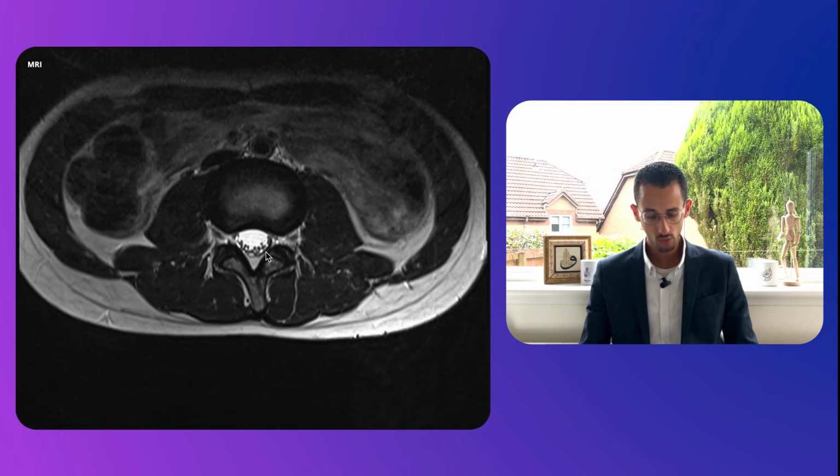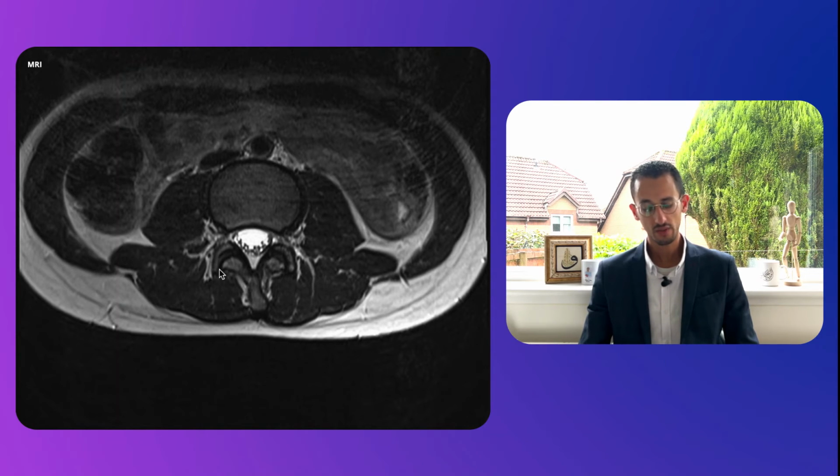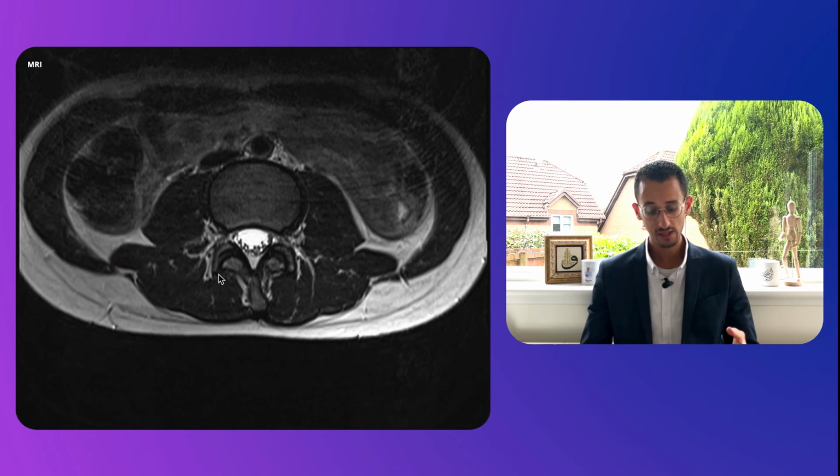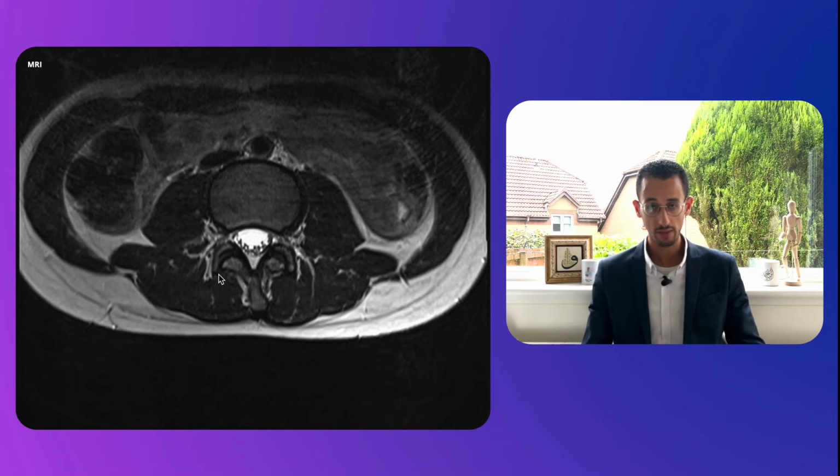What we also have to look for is the facet joint. So you can see here that's the facet joint, which looks like a hypointense part here and here. You can see that looks like a joint. It's very easy to recognize on this axial imaging, and you have to see, is there a signal coming out of this? Is it white? That means that there is something wrong with this facet. Does this facet look like it's in place? Is it overgrown and hypertrophied and causing pressure on the foramen or the rest of the spinal canal?